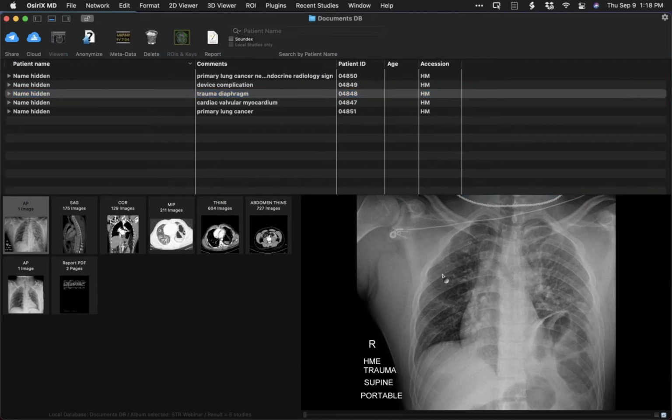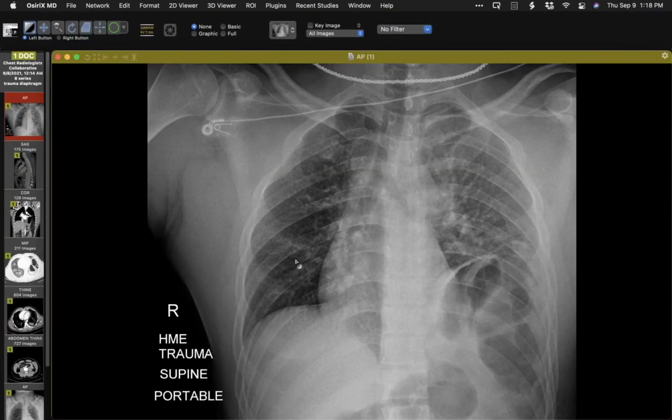Here is a nice radiograph for residents taking care of overnight trauma patients. Usually when we see the history of trauma there, you think, okay, blunt chest trauma, next case. But, well, not next case, but blunt chest trauma. See this, and something unusual: dilated bowel. Is there something odd over there? But this isn't blunt chest trauma. This is a stabbing victim. So I'll show you the CT now to further clarify what's going on there.